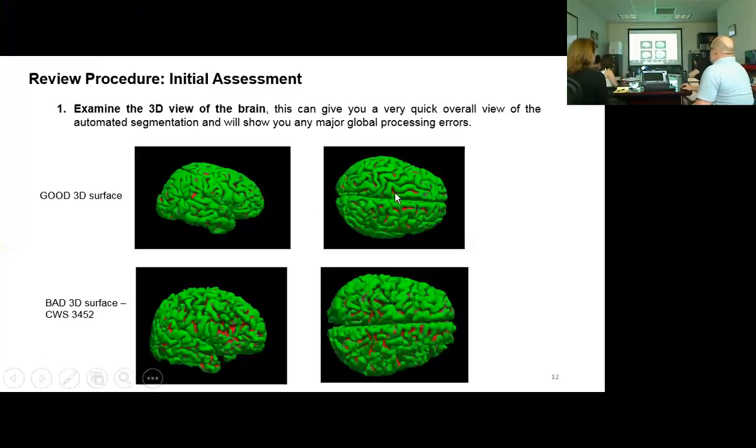If you look at this top row here, this is a lateral view of the right hemisphere, and here's a top-down view. You can see in this scan that the gyri seem relatively full, and you see relatively little red here. The green-red here is basically surface curvature. The green indicates gyri, and red are sulci. There are these tertiary sulci, really small minor sulci, where you see some red exposure, but it's relatively small.